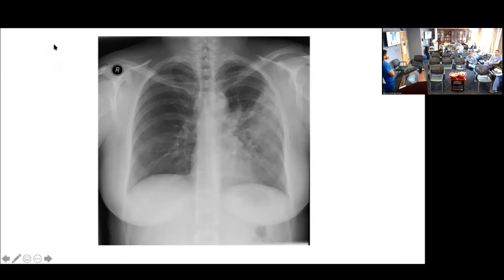So really, in the left lung, there's only the upper and lower lobes. So it's probably the left upper lobe. It doesn't occupy the apex of the lung, so this is actually in the lingula. The lingula is like the equivalent of the middle lobe of the left side. So there's the apical portion of the left lung and the lingula. And actually, this is inferior lingula, because the inferior lingular pneumonia silhouettes the heart.